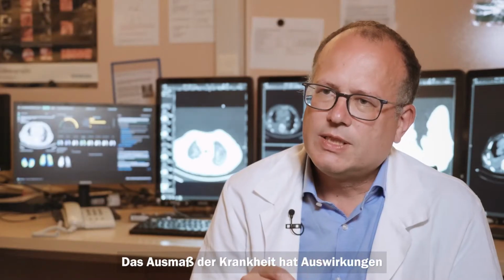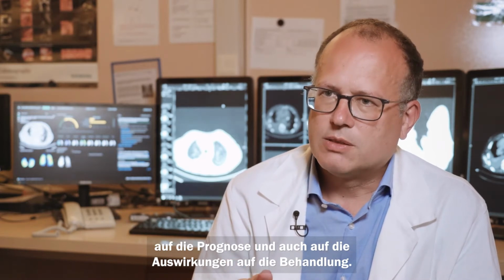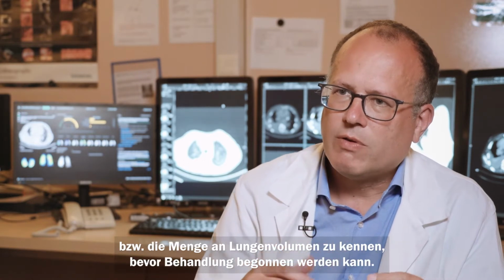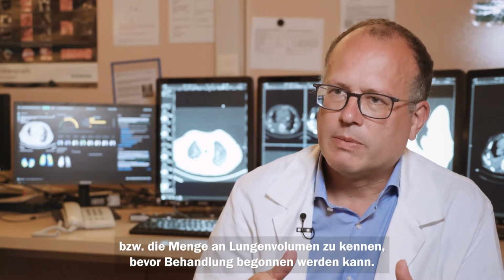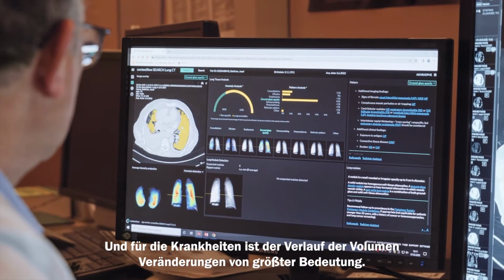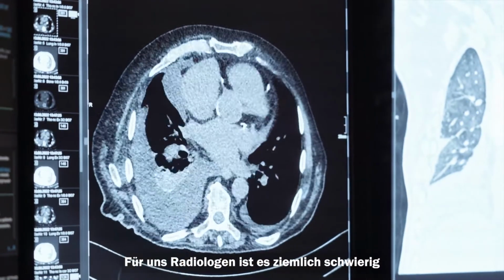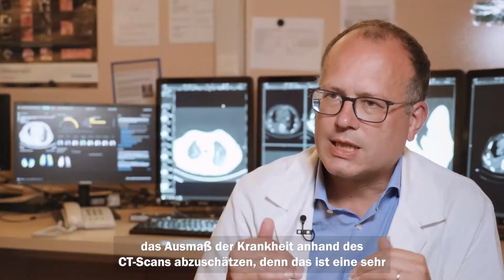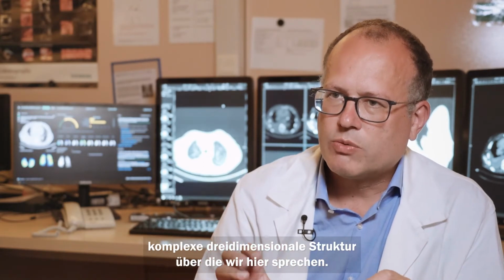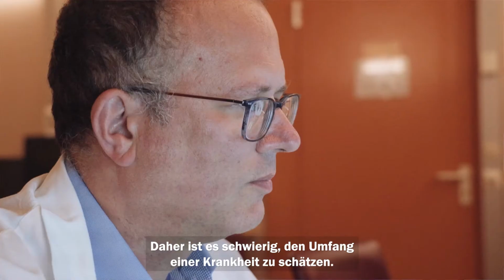The extent of disease actually has prognostic implications and also treatment implications. For some treatments, you need a certain amount of lung volume to be involved before treatment can get started. And for other diseases, the course of volume changes is of paramount importance. So for us radiologists, it's quite difficult to estimate disease extent based on a CT scan, because that's a very complex three-dimensional structure we're talking about here. And so to estimate the volume of a disease is quite difficult.